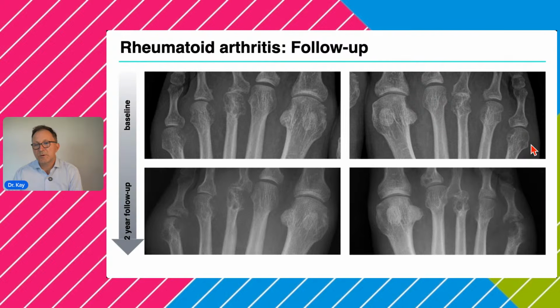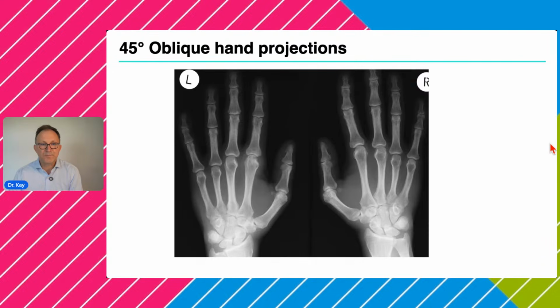I don't know if you would mention those in your report, but you can see 2 years later these precursor erosions are now full erosions, taking away the bone and destroying this joint. Similar changes are also here on the other side. This is really something you should be aware of, that these cystic changes might play a role.